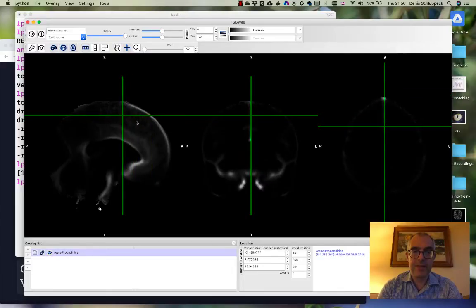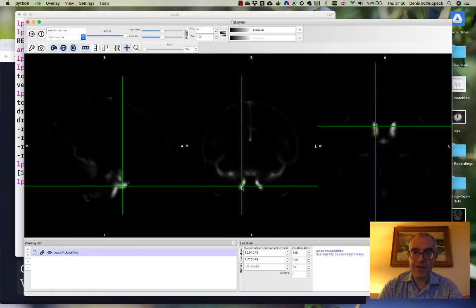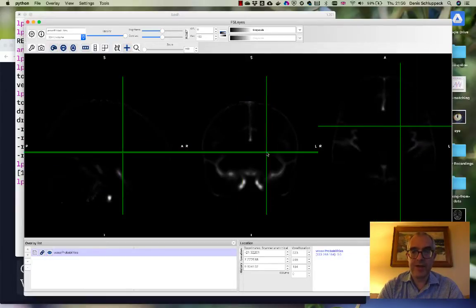And one useful way to think about this is where there's a bright spot in the image, if you were to measure in another person's scan, you're very likely to hit this particular vessel because it's present in all of them. Whereas if you hit a dark spot, you're very unlikely, or actually maybe there's zero probability that you'd hit a particular vessel there. There are no blood vessels there of a particular size.